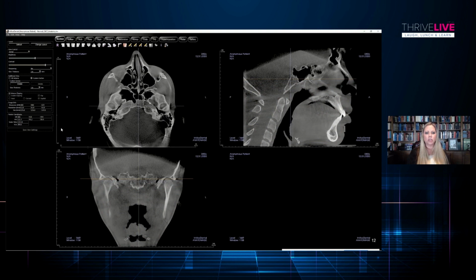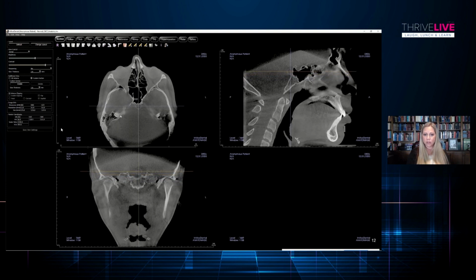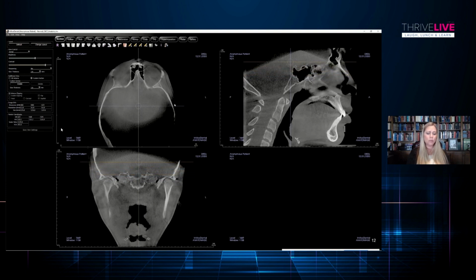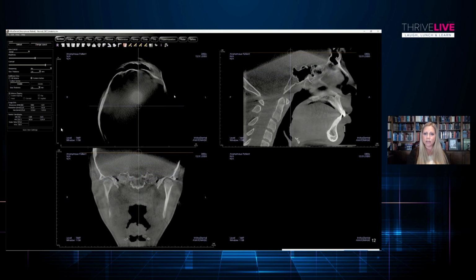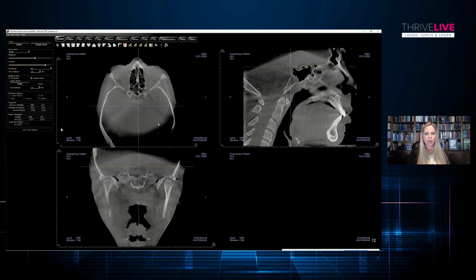And then on up into our cranial base. So, for instance, we can look at the horizontal portion of our internal carotid arteries. We might want to look at our external auditory canals, and we can look at symmetry. We can see the ear bones. We can see the internal auditory canals as well, and our mastoid air cells. They should be fairly symmetrical, but sometimes mastoid air cells will pneumatize, and they can pneumatize anywhere throughout our temporal bone.